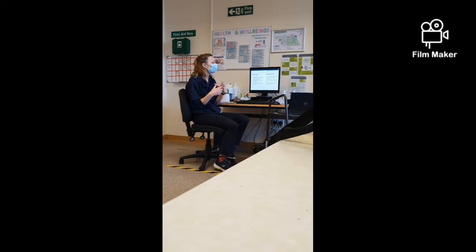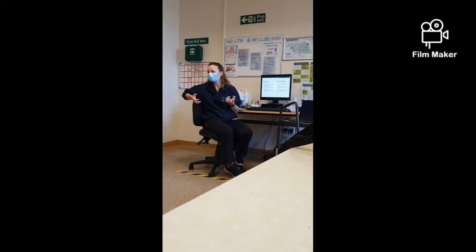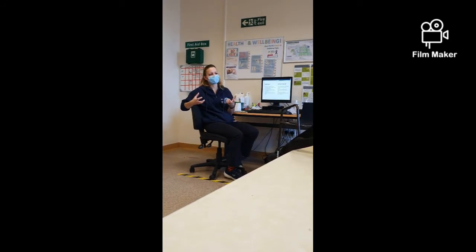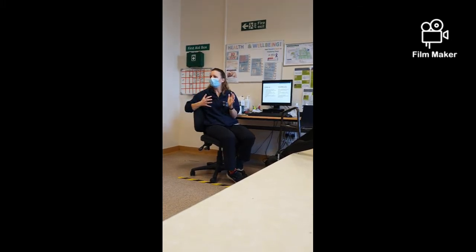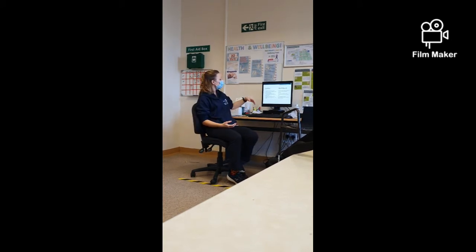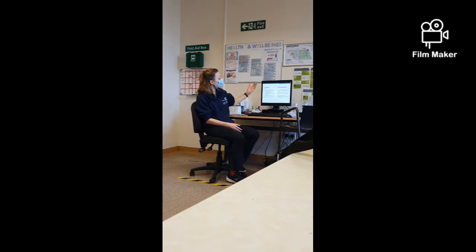I've got some examples showing you an enlarged heart. So we're looking at the heart, we're looking that it's not taking up more than 50% of the thoracic window. We're also looking that it's in the right position. So again, if we go back to thinking about your pneumothoraxes or your atelectasis and collapse, if something is pushing or pulling the lung, it will also move the heart as well. So we're making sure that it is in the position it should be. It should lie a third to the right hand side and 2/3 to the left hand side in a PA film.